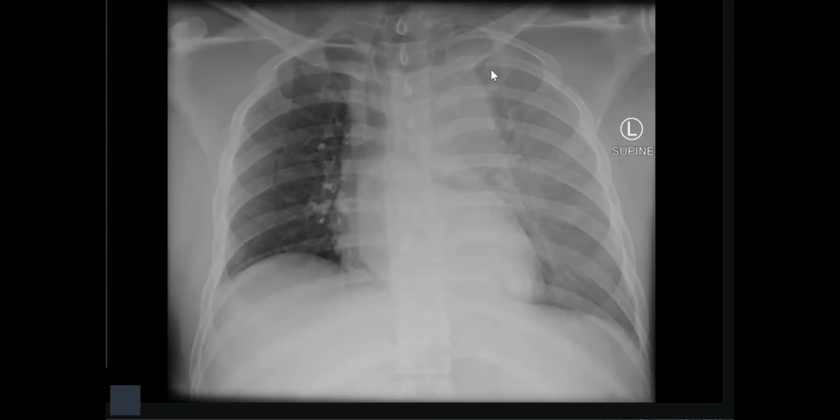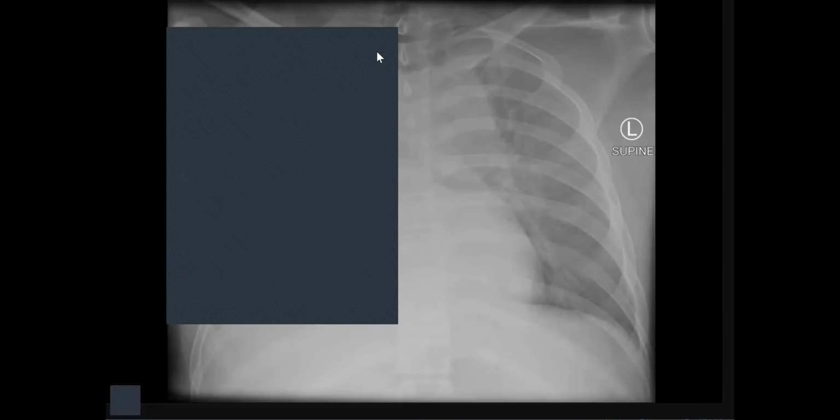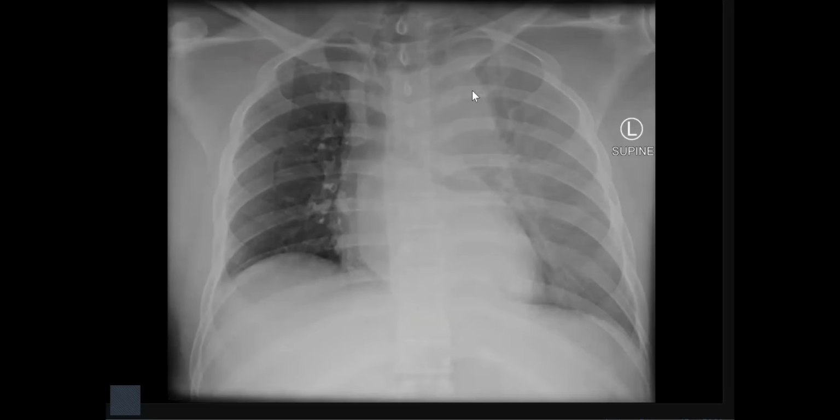It's very important to mention pertinent negatives. I'm dealing now with a case like a short report. What is a pertinent negative? You mentioned no definite rib fracture, because CT scan is superior, and also intact hemidiaphragm. It's important in the clinical setting. So fractures and hemidiaphragm. Now you suspected mediastinal hematoma and you asked for contrast enhanced CT scan and also urgent cardiovascular assessment.